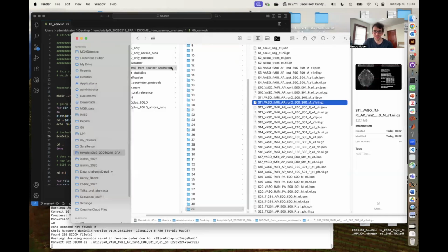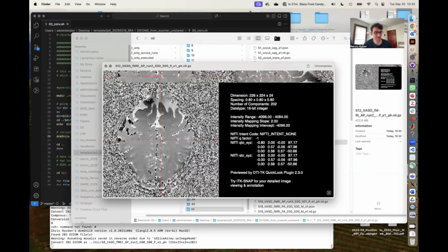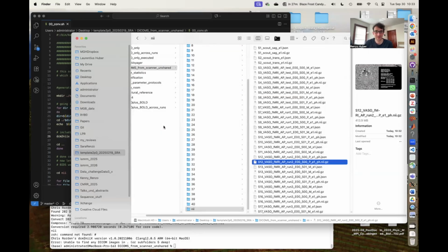And it's a magnitude image. Some people like phase data as well. So here, for example, people use phase data for denoising purposes or for detecting specific veins or gray matter, white matter segmentation. They're all included here, but we will ignore the phase data for now.